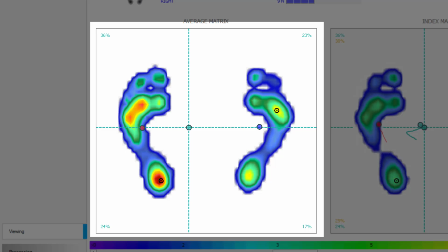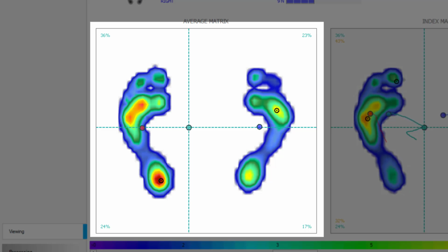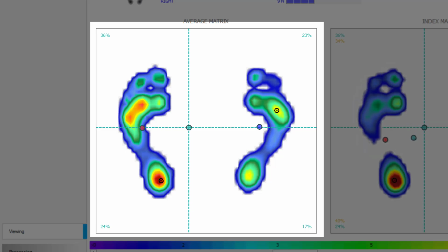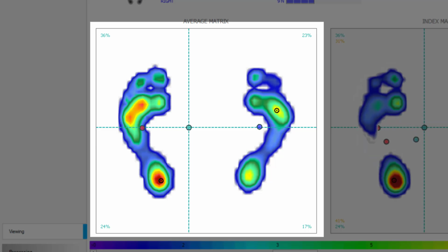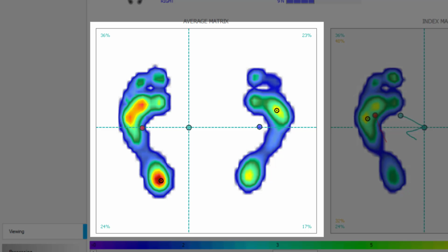This may allow a completely different conclusion to be drawn about the ascending muscle chains. In a 40-to-10 balance, the tension ratio between dorsiflexors and plantar flexors will be completely different than in a 25-25 balance. Look at pelvic torsion or pelvic rotation when the situation varies from side to side. Or at the pelvic tilt and lordosis angle in the case of a higher forefoot or rear foot loading on both sides.